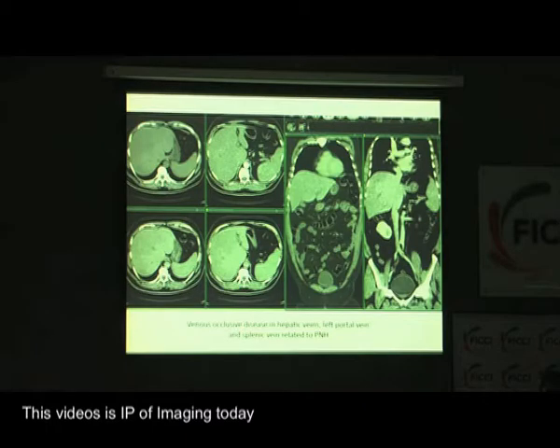Here's another patient where if you look at this arterial phase scan, you can see that there is adequate contrast in the aorta, and this was a proper protocol done study. But when we started looking at the venous phase and the portal venous and the hepatic venous phase, we found that the liver did not really take up too much contrast. And the reason for that was that this was actually a semi-congested liver because there was hepatic vein thrombosis, which you can see here, here, and here. And as a result of which the liver parenchyma did not really enhance.